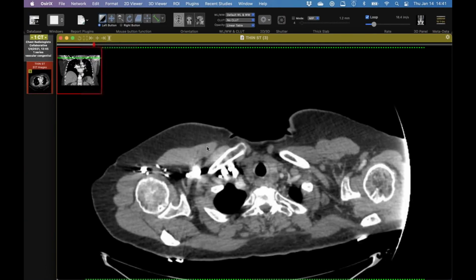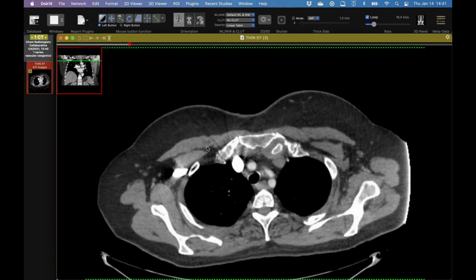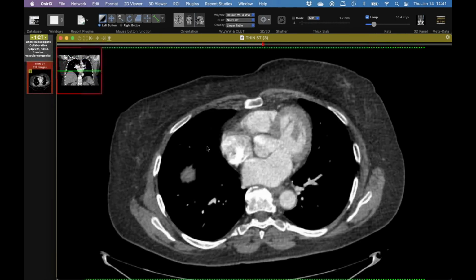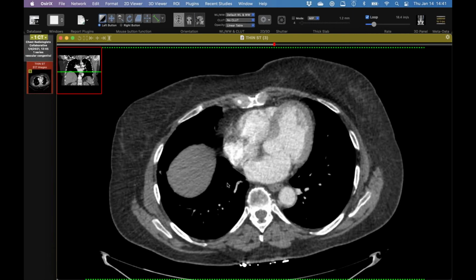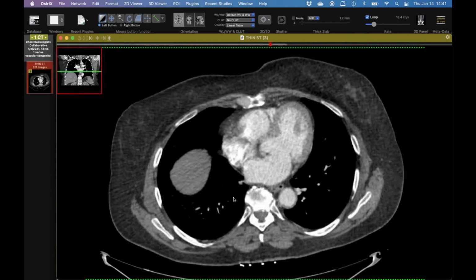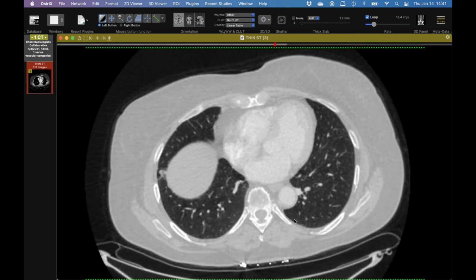Yeah, we see these pretty much on almost everyone we scan, it seems like. I'm going to chalk it up to histo, just given the pretest probability. But that's a good point. Good point about dirofilaria. I can never say that word. The heartworm, Dirofilaria immitis. Yeah.